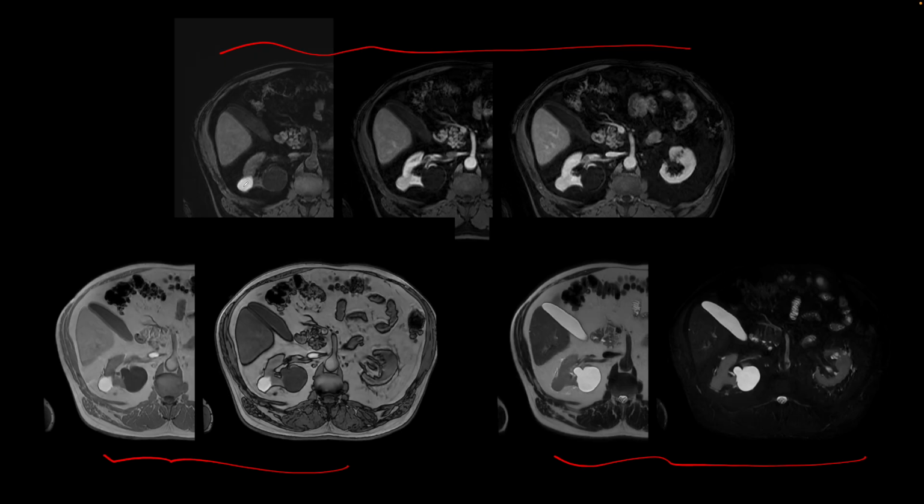Let's start with this one here in the right kidney. This is T1 bright and does not show any enhancement. This stays T1 bright from in to out of phase images and stays low signal on T2 weighted images and fat saturated T2 weighted images. So putting everything together, this is a hemorrhagic or proteinaceous cyst, and so this will be a Bosniak 2.